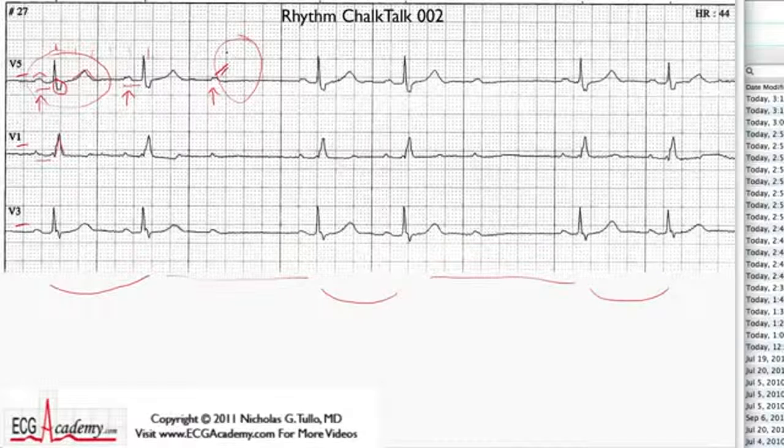So it appears that AV block had occurred because this P wave never got down to the ventricles, and somewhere in the AV conduction system the signal never got through. Well, let's keep on going. Following this pause, there is another PR interval that's 0.2 or so, another one that's fairly constant, and then this P wave blocks. And so you have AV block with a fixed PR interval.